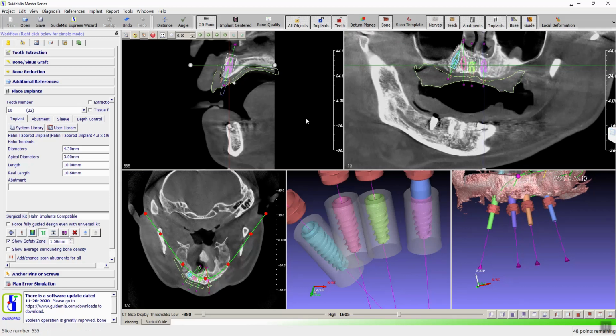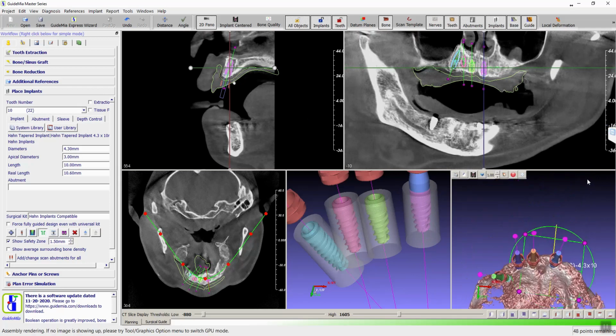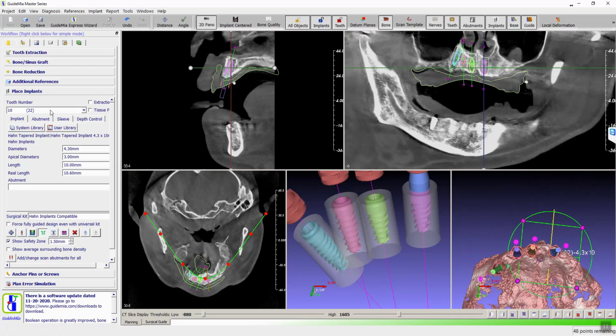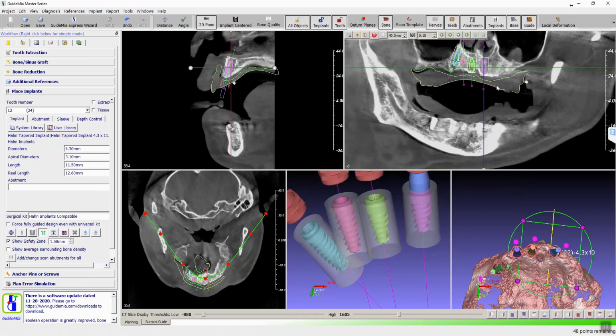Maybe a little bit more. Looks good to you? Yeah, that's fine. We can just move on. We'll change it later. Okay, 10, 12, maybe. Wait a moment. Do we want to see 11 for this guy? Yeah, let's go with 11.